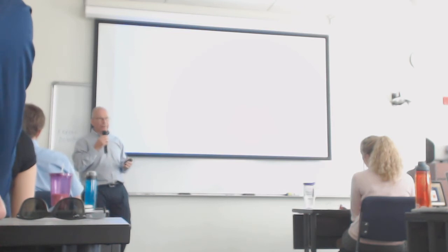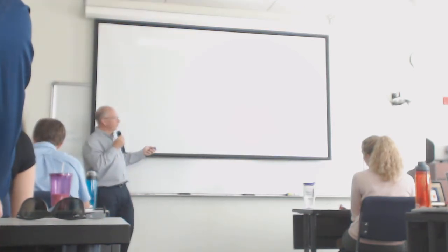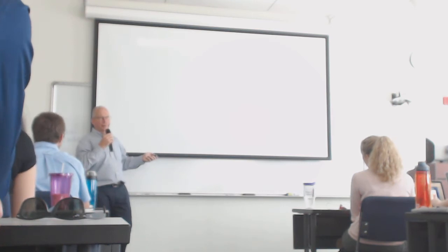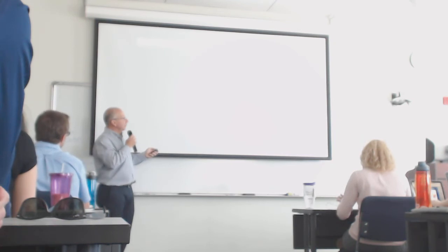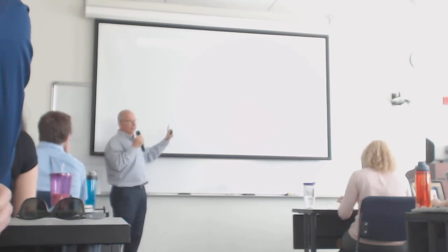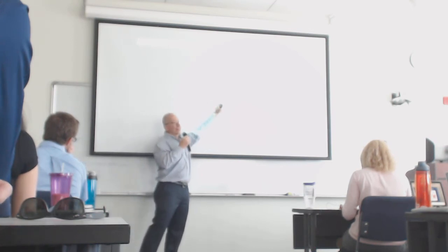Patient has the worst headache of their life. You do a CT scan. They have that appearance. That's an aneurysm. It's a ruptured aneurysm. You got to find it. Now, most of the time, if it's a left middle cerebral artery aneurysm, then most of the abnormality is going to be on the left.